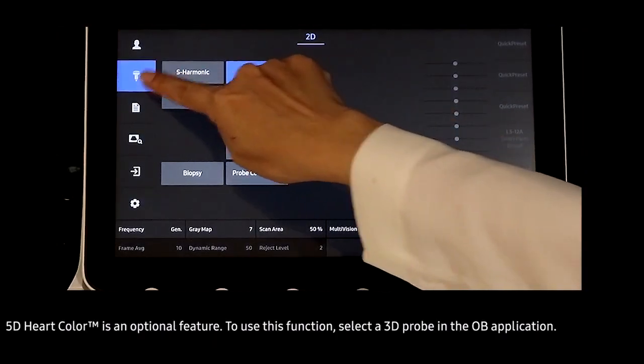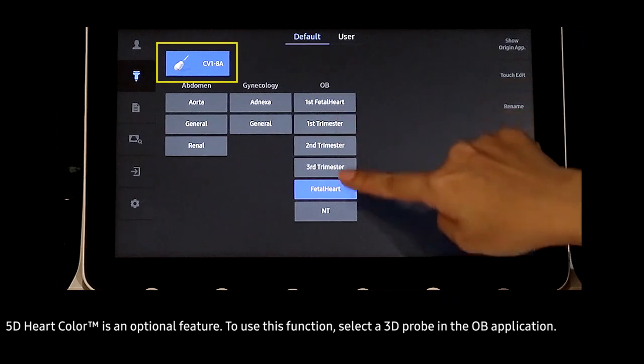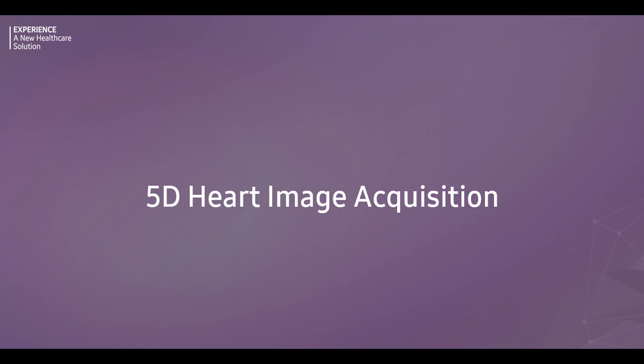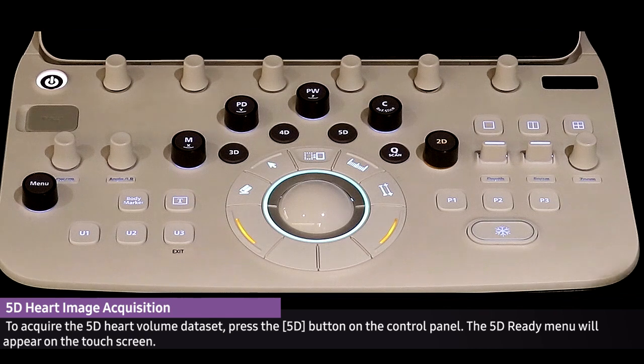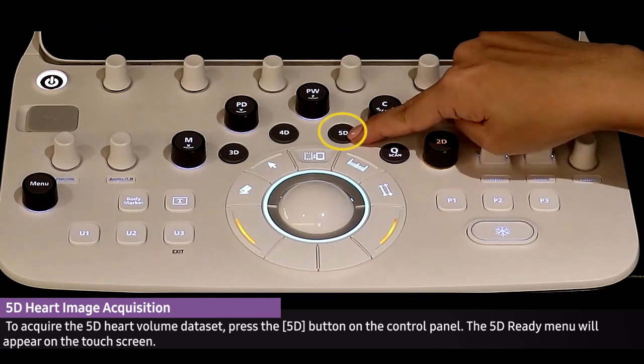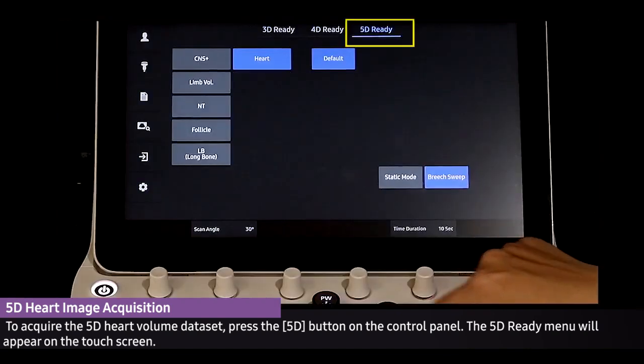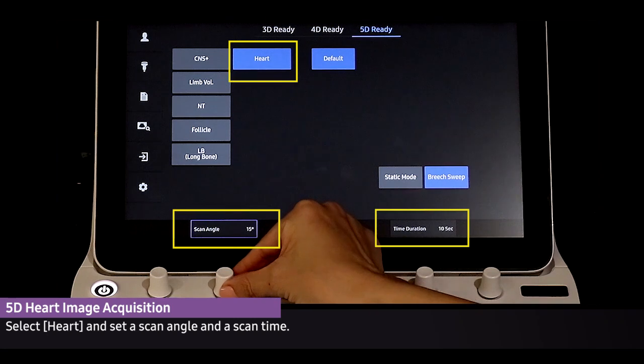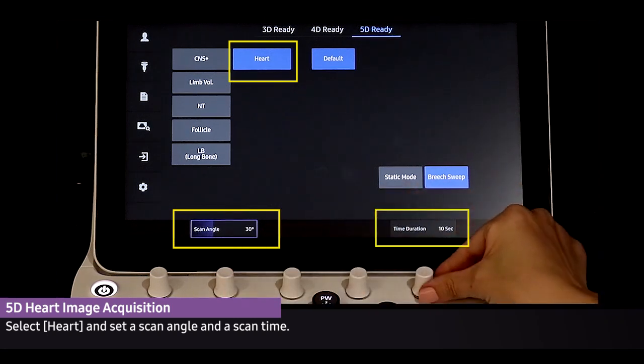5D Heart Color is an optional feature. To use this function, select the 3D probe in the OB application. To acquire the 5D Heart volume dataset, press the 5D button on the control panel. The 5D Ready menu will appear on the touchscreen. Select Heart and set a scan angle and a scan time.